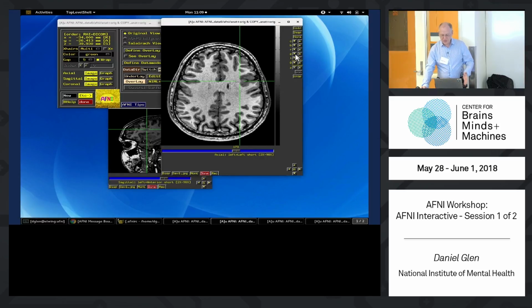There are other controls. I like this gamma value control, the one that has a G, but most people don't use it. It's very popular in radiology, so it's there too. Okay, so a couple controls on that. We'll get to what this 8 is for later. The Z key, this is a good one to use.